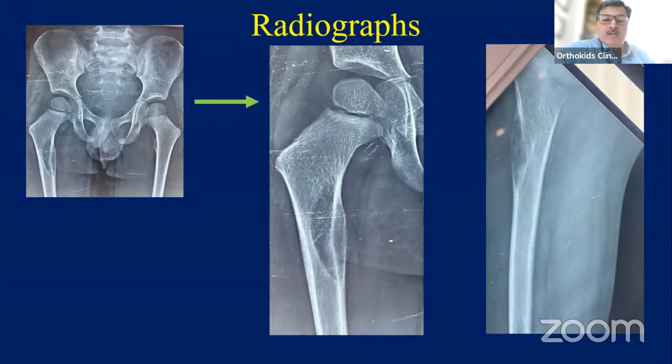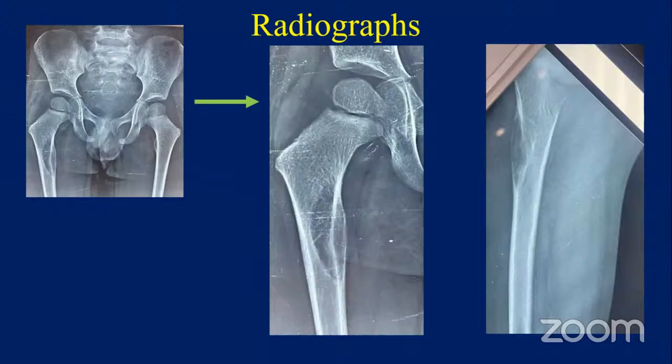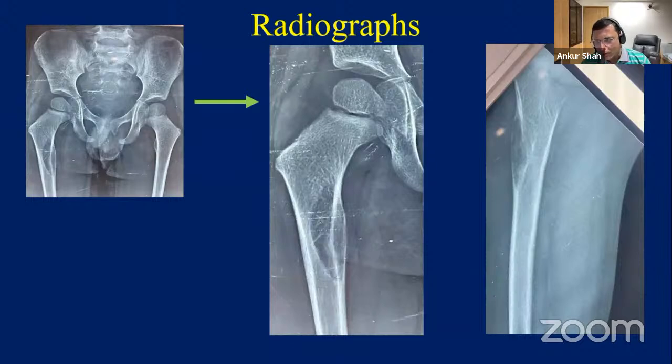So what possibilities would you think based on this X-ray? It looks like not a completely non-aggressive lesion because it is causing significant thinning of the cortex and some minimal periosteal reaction, but we need to do an MR probably for the lesion.